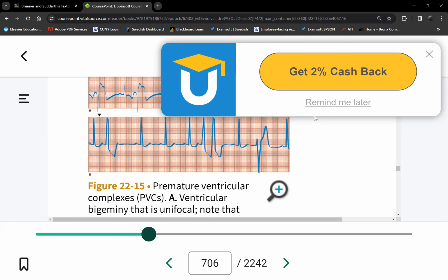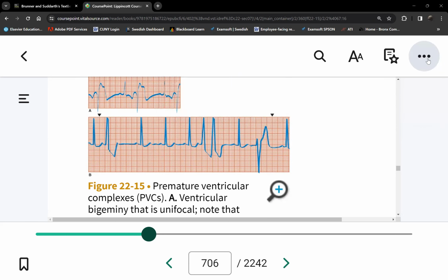So is this really 2 seconds? Not at all, right? So imagine that there are 5 PVCs in a row. Is that really 5 seconds? No, only 1.5 seconds, right? Therefore, if the patient experiences that duration of VTAC, does the patient even feel it? No, because it's so short, right?